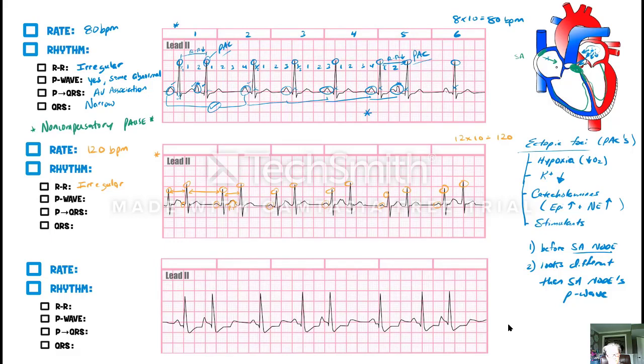And again, you have a normal P wave. Again, you have your ST segment, T wave. It looks like the P wave from this ectopic focus fired around the same time, so that's going to be the fusion between the P wave and T wave. And again, you got another P wave. Again, another PT fusion, another PT fusion, and another PT fusion. So yes, I can see P waves in some of them, but some of them are abnormal.